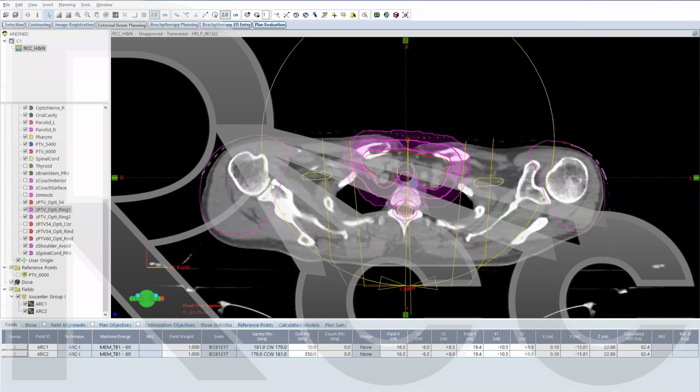Yes, but for Eclipse, I want to understand your method for Eclipse. Do you use any cost function for the body? For the body means from the target to the body. Do you use any cost function? So in Eclipse, we'll see it once we enter into the optimization. I do put in a cost function for the body at 0 millimeters away from the target. And it's got a sort of exponential drop off, which I'll show you that equation once we enter into the optimization. I'll show you exactly what that is. Okay. Yeah. Thank you very much. Yeah. Thank you, Javier.